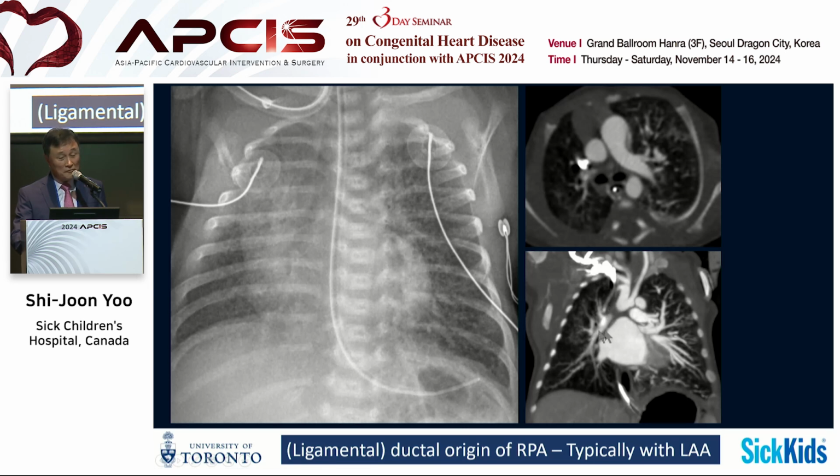Okay? So if you find this disease at this stage, then your cardiologist can probe this one and put a stent in and make the RPA grow for the later unifocalization of right and left together.